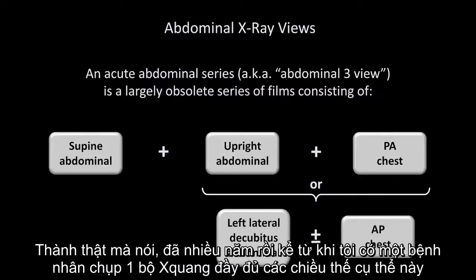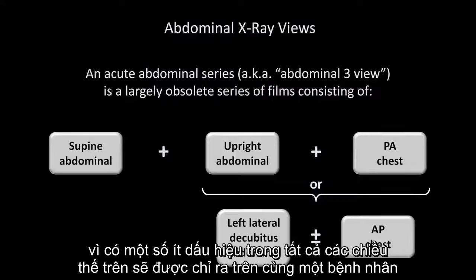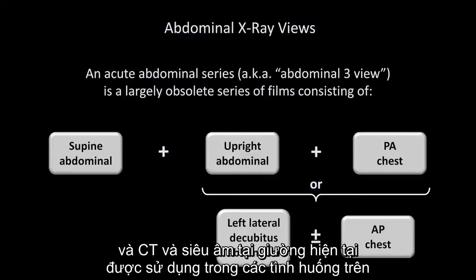It's honestly been years since I've had a patient receive this specific collection of films, as there are few indications in which all these views would be indicated in the same patient, and CT and point-of-care ultrasound are now used in such situations.